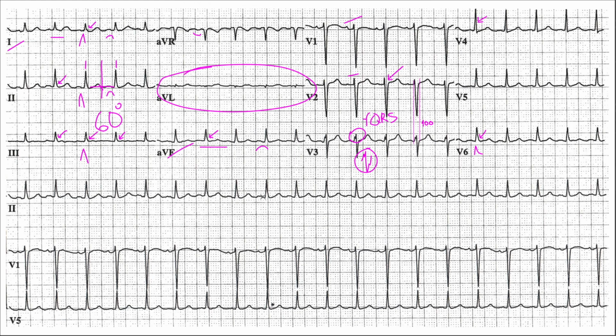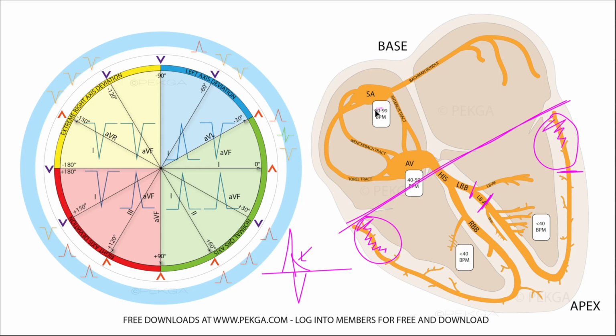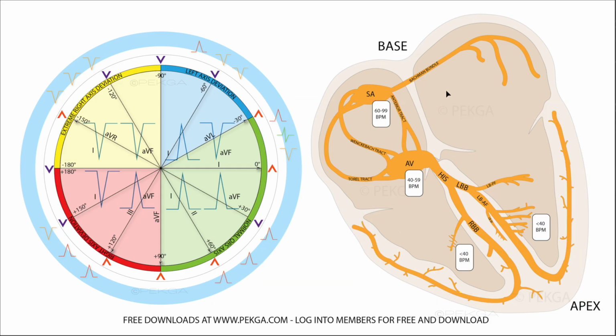When we add all of this stuff up together, what do we have here? Oh, by the way, let's not pack up our bags yet. I want to discuss left atrial anomaly or left atrial enlargement a little bit further. So we talked about these basal regions here. So we talked about left atrial enlargement, right?